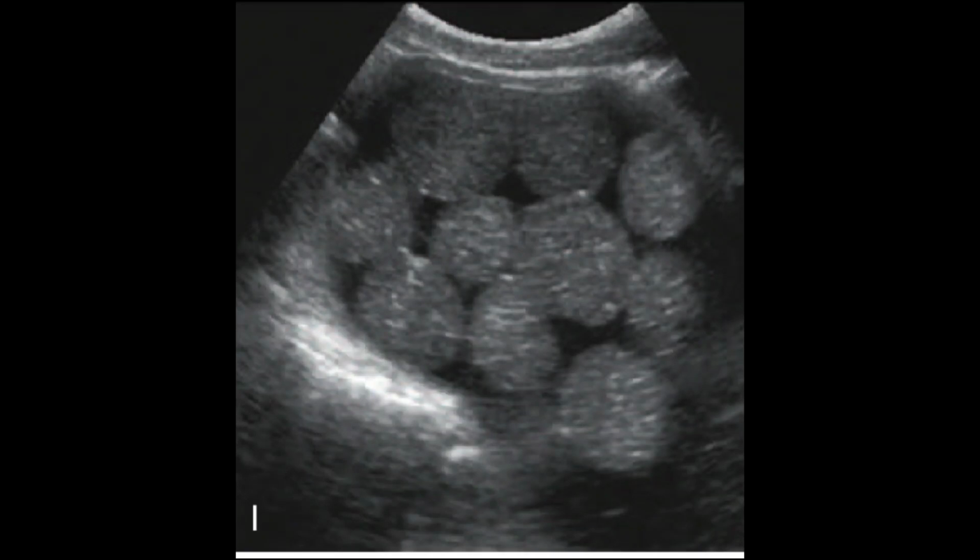So if you have seen all that, it will be in the back of your mind, and while you are scanning, if you come across such a lesion, it will come into your consciousness, and you will realize that you have seen these characteristic features somewhere. So you will eventually reach the conclusion that this is a dermoid lesion.